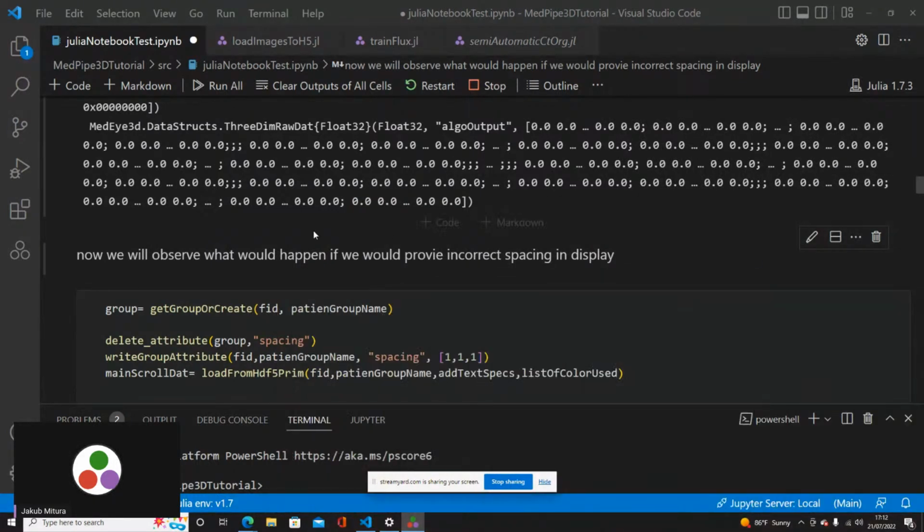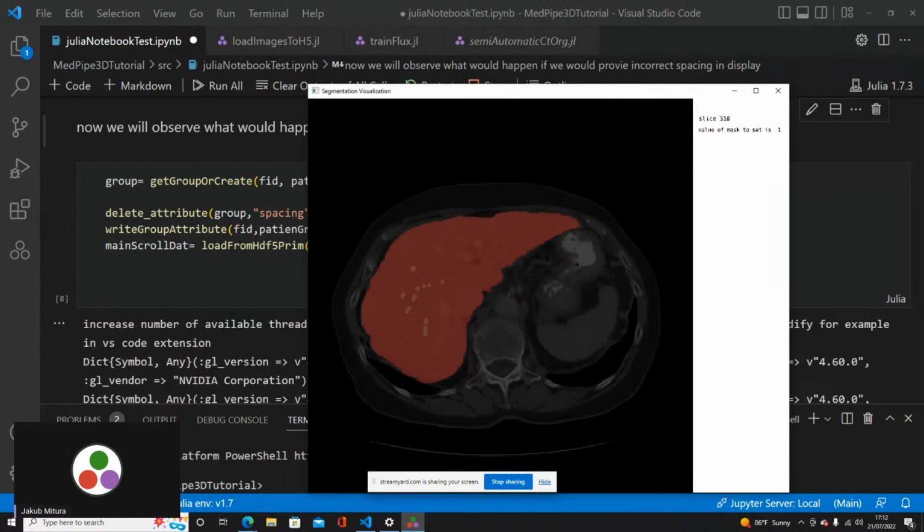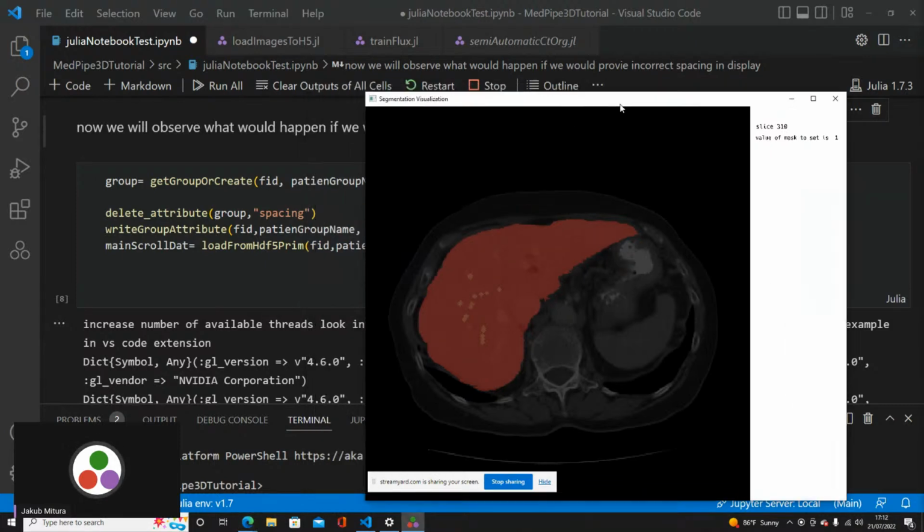Okay, no questions for a moment. Good. And now, another very important part that I want to show you about this spacing. We'll play a bit with the spacing. Does everybody follow? Yes. Anybody needs help? Okay. If you want, let me know.